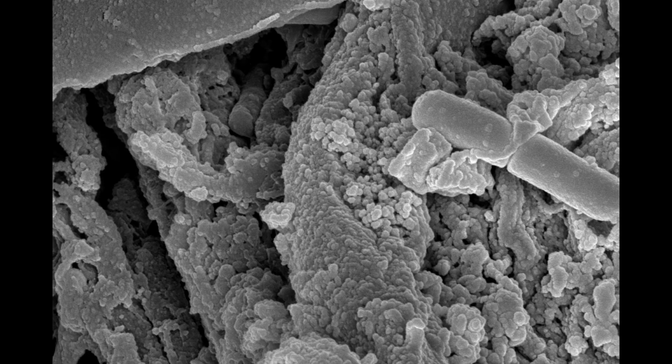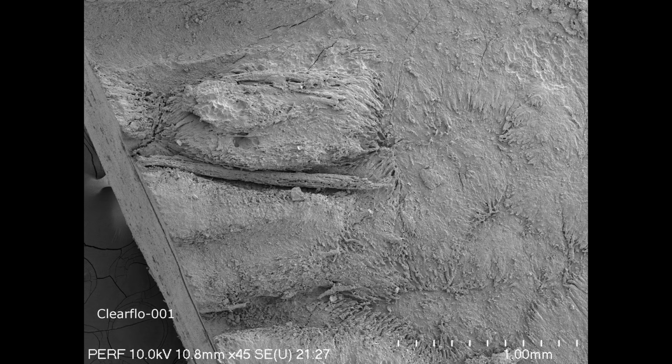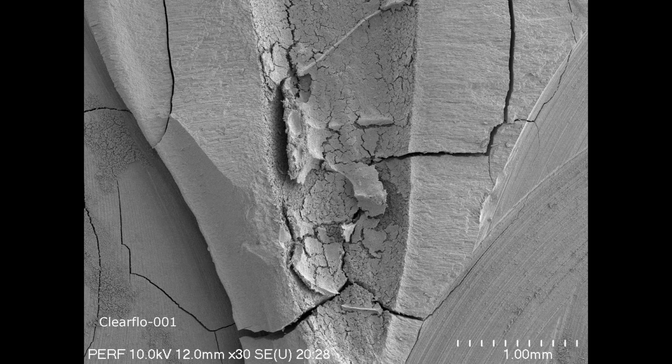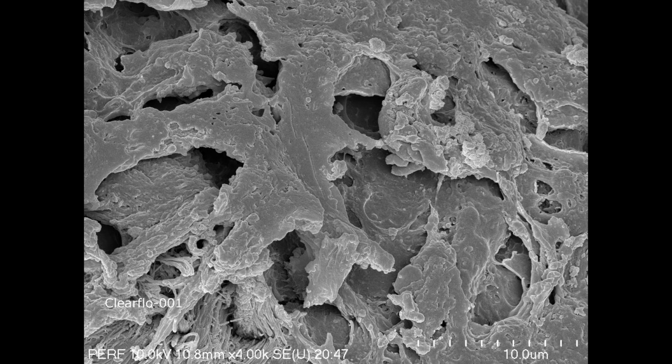I believe these were all MIE kind of cases, but when you go in and look in detail, there's quite a bit of biofilm present pretty much wherever we looked, and also quite a bit of pulp tissue. In many areas it looks like there was intact pulp tissue still present that has obviously been disrupted, but around the pulp tissue there was pretty extensive biofilm and a lot of blood, hematogenous material all along the walls.